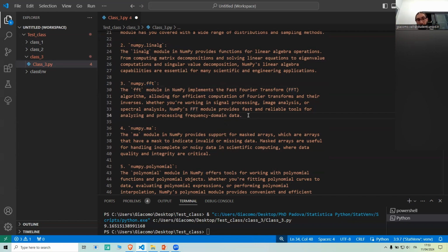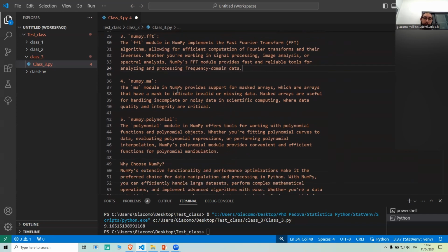But the slightly different functions offer a lot of customizability on the other side and always allow you to select the best approach for your specific study. So for example, for your specific data type, for the dimension of your array, or simply for the kind of result you want to obtain.